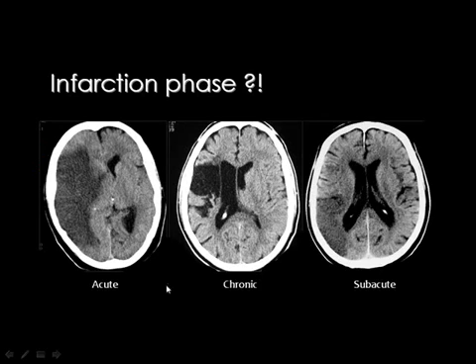The acute infarction is an infarction which is surrounded by brain edema, then it has the chance to compress the ventricle. Then we call this acute infarction. But after some time, this infarction will liquefy, and the brain tissue will be liquefied, and transferred into an area of fluid density. Then the result will be loss of volume of the infarcted brain tissue. Then the ventricle adjacent to the infarction will dilate to compensate for the loss of volume.